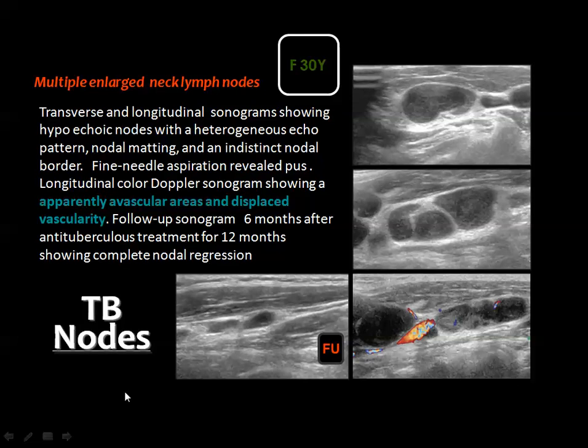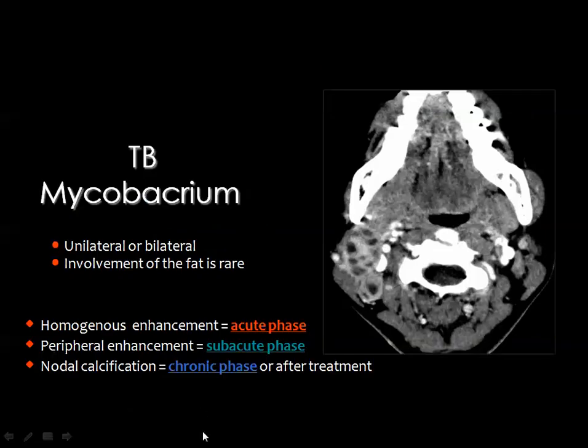This appearance is usually characteristic for TB lymphadenopathy, especially in the cervical and in the thoracic area and also in the abdomen. You see that the nodes are marginally enhanced and they contain necrotic center, and each of the node is usually simulating a small abscess. Most of the nodes are usually amalgamated together, as you can see here.